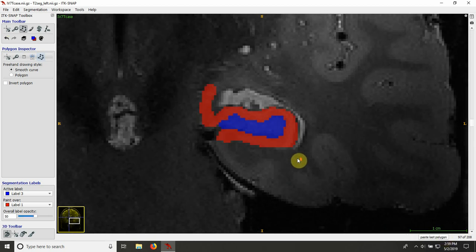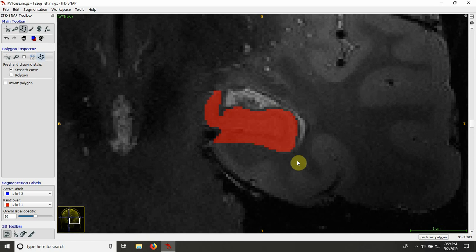So going in the opposite direction, I can again follow the dark band here. And then inwards here. Again, I think this is alveus going all the way inwards, and then the gray matter is wrapping around it. So I think this is more or less the outline of the dentate gyrus.